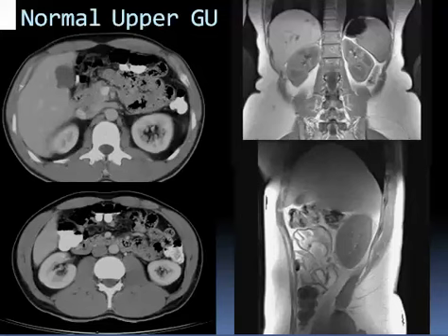Normal genitourinary tract by CT. I think you have the chance now to see that there is a thin layer of fascia surrounding the kidney, containing fat inside and surrounded with fat outside. And here the appearance is not well defined. No, yes, it is there. There is a line here, but it's not well defined like this one.